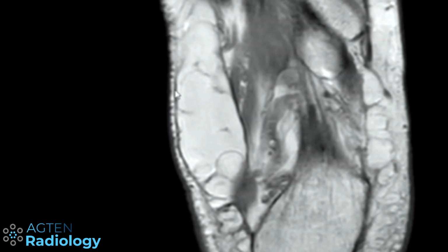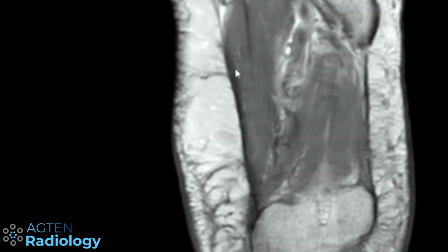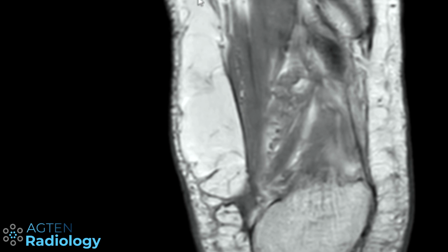And you can see there's a capsule. It's kind of sharp here. There are no septations. It's even impressing or pushing the musculature a little bit away here. Here you can see how this is about, what's the size, so you can start to measure it here. Maybe it's even like this, and maybe even this large.